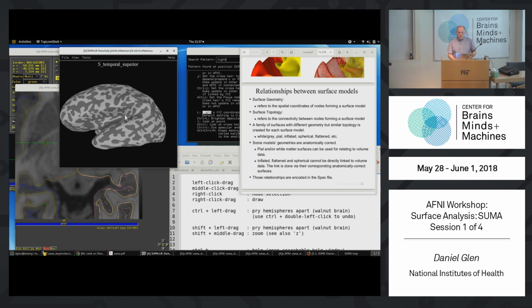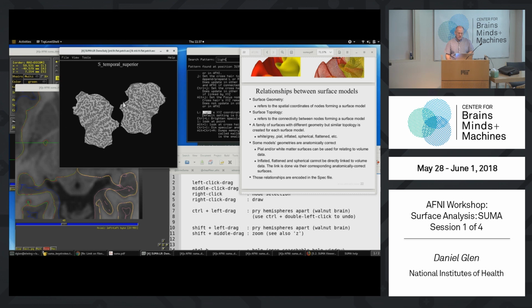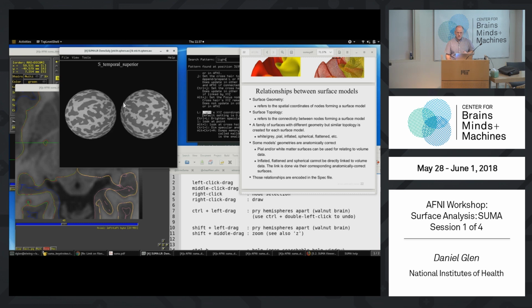They're in roughly the right place, but their XYZ coordinates in here are not really defined well. The coordinates that they come from are defined well, so we can identify what anything is by looking at the same node across this family of surfaces and see the coordinate for that, even in the inflated surfaces and even on the flat maps and in the spheres.